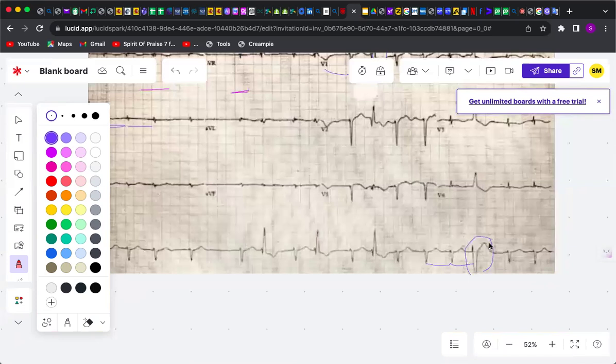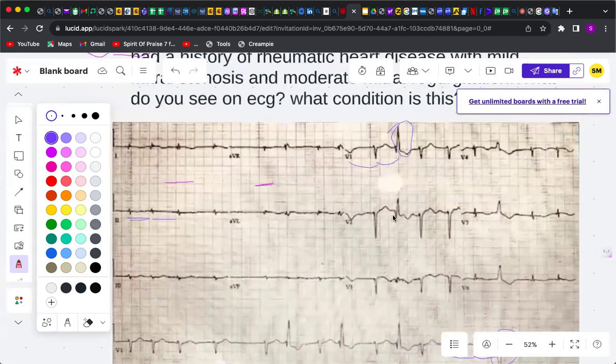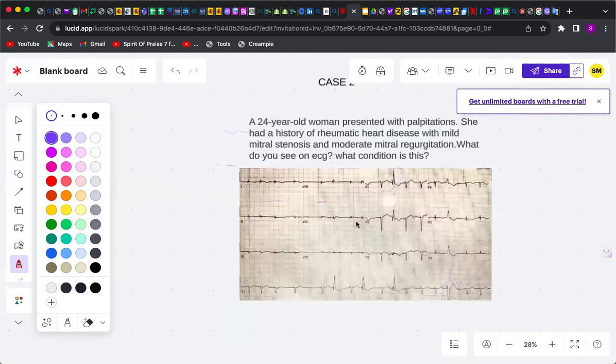So this would probably be a PVC, right? So yeah, and that was that for this case, typical Ashman phenomenon.